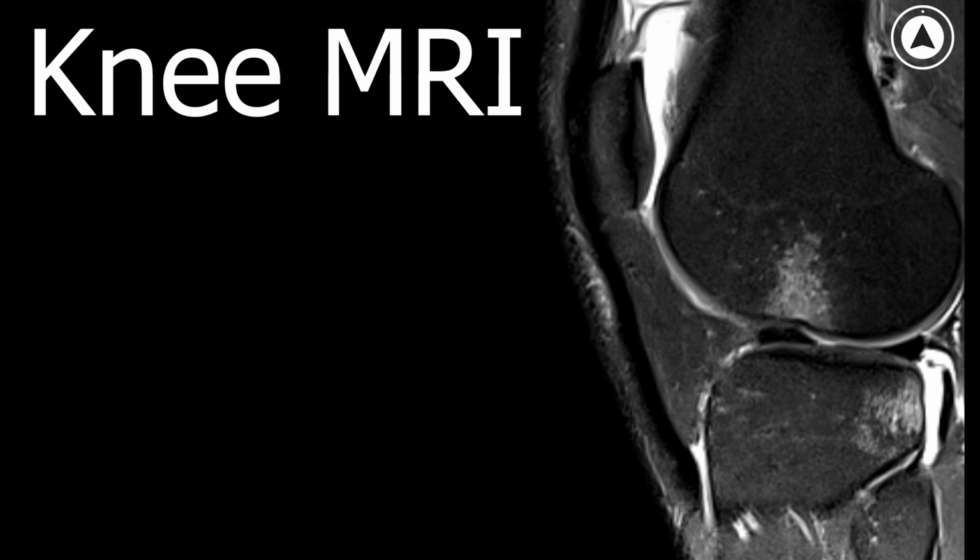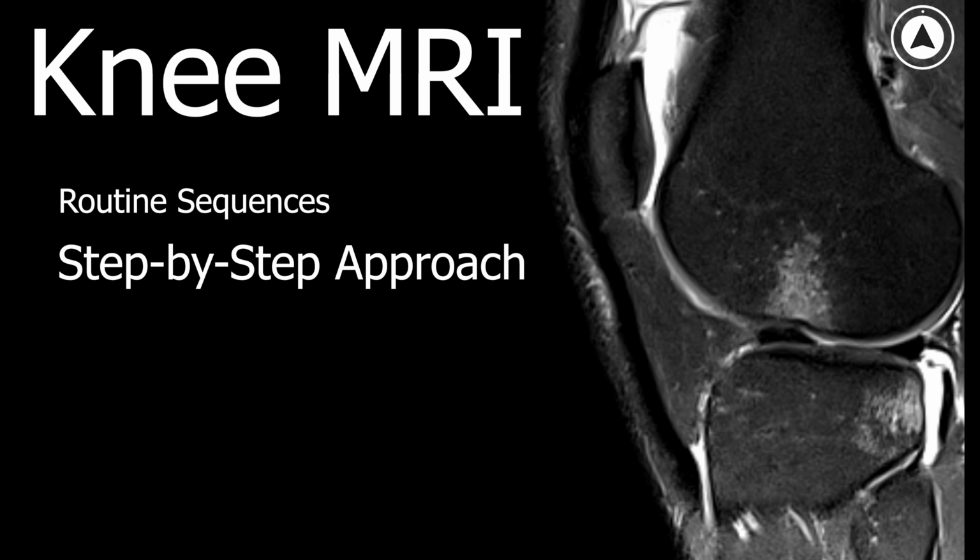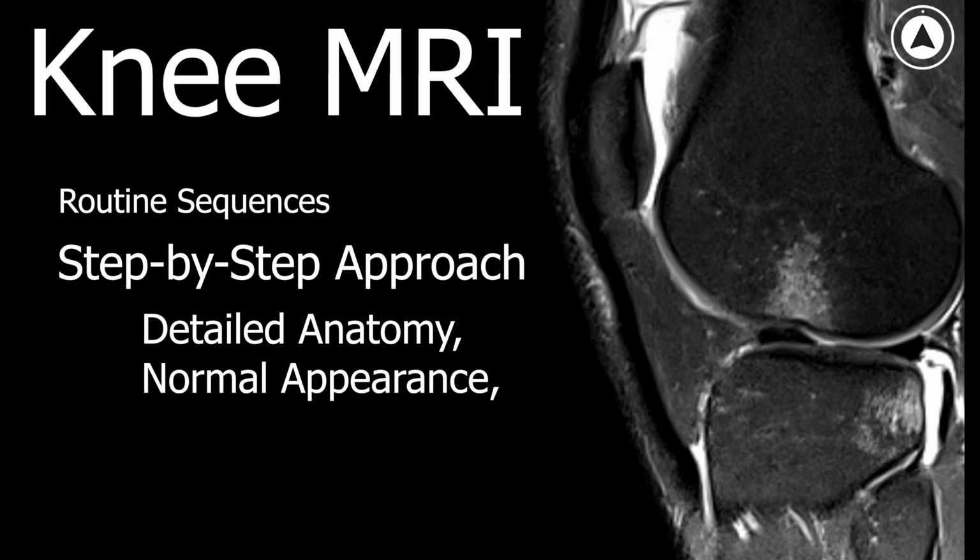In this video, after a quick orientation to routine sequences, Angela will take you through her step-by-step approach, including a detailed look at anatomy, what normal looks like, and exactly what to look for in each structure. This concise yet comprehensive review compresses years of knowledge into one practical video. I wish I had this when I was a resident. It would have saved me a lot of time.